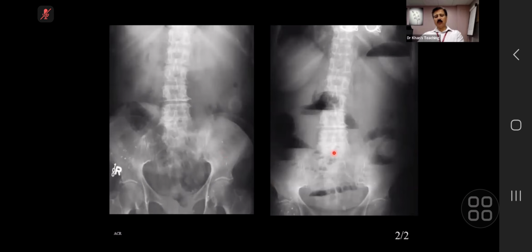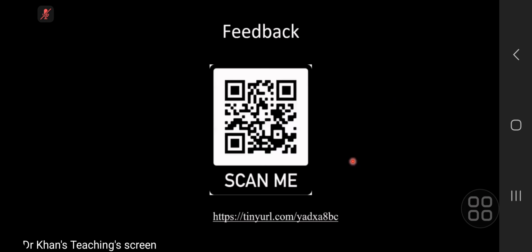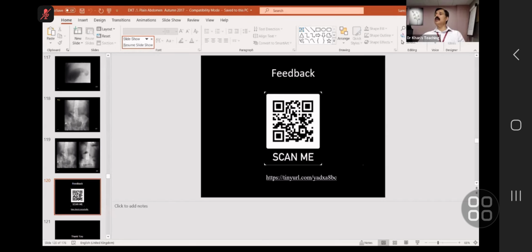Excellent. This is an erect film, which just to develop the same thing, you see this string of bead sign, string of pearl sign, dilated loops, and this is inside gallstone ileus. So we finish this, and thank you very much, candidate 8, and we are going to candidate 9. I will crack on for the next 5-7 minutes, and then we will give you a break.